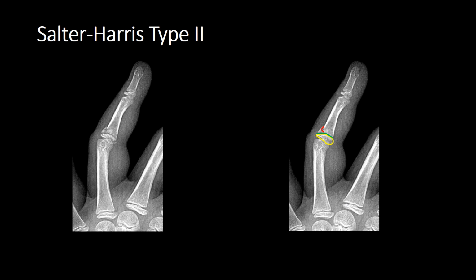Let's have a look at the distal phalanx first. Here we can see the lucent line of the epiphysis, and then underneath, remember at the end of the long bones, you have the epiphysis. But we've got a slightly oblique view of that epiphysis because we're semi-looking at the undersurface. And if you look carefully, you can see what appears to be almost like a lucent line across the epiphysis, and what that actually is, it's the end of the metaphysis creating that sort of appearance, and it mustn't be misconstrued as a fracture.